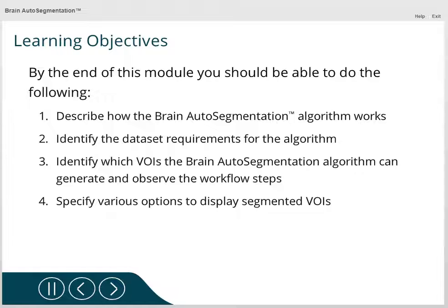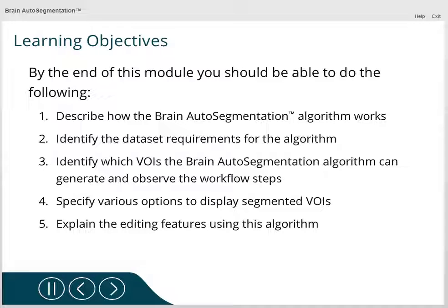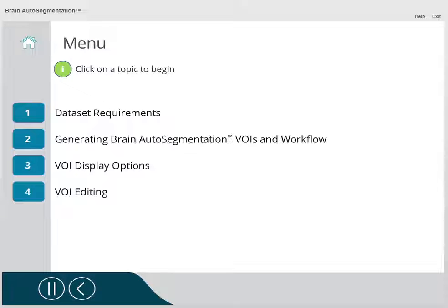Specify various options to display segmented VOIs. Explain the editing features using this algorithm. Click on one of the following topics to begin the course.